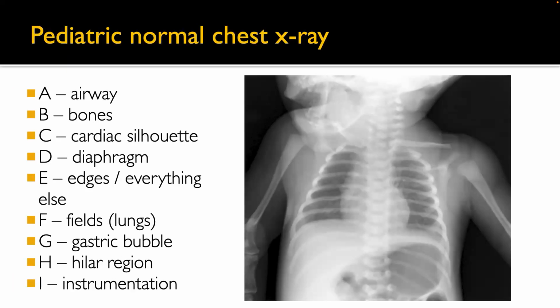For pediatric patients, not much difference. Same process. But again, what I talked about earlier: is the chest X-ray good? On this one, you can actually see whether the clavicles are straight out at you. Okay, so this one is actually rotated a little bit. That's why the kid's heart looks like it's going over to the right side. The other piece for pediatrics too, they still have a big thymus. This organ helps out with the white blood cells, but the thymus is still present, so what looks like it might be a mass is actually normal for kids.